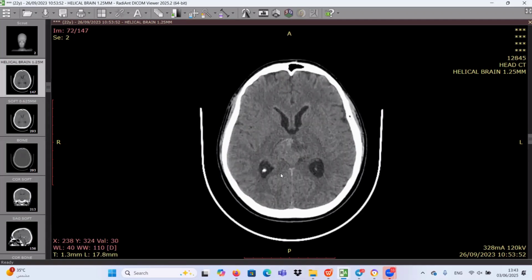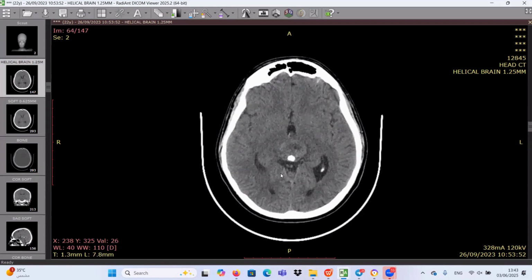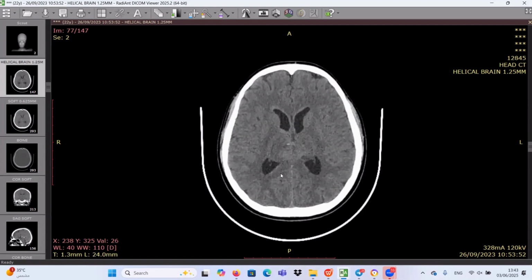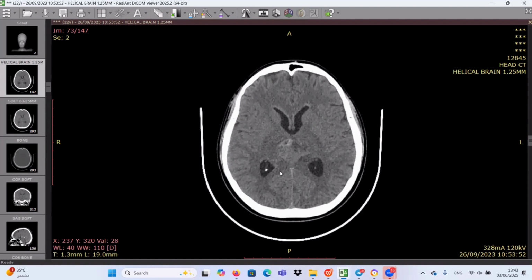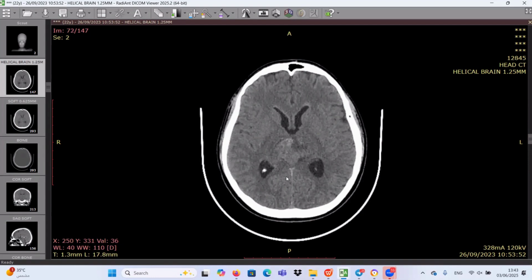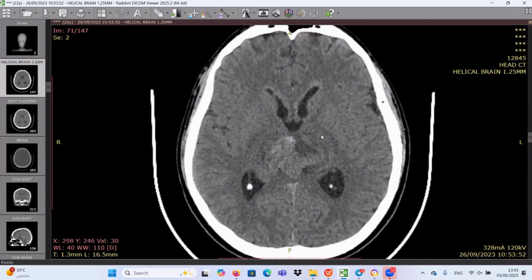And do you have any more extra abnormality? Is there any hydrocephalic changes? There is mild dilatation of both lateral ventricles. I agree with you. Okay. Do you have any more abnormalities? I am sorry that the CT scan was done without contrast. Okay. But let's try together to find any more abnormalities. Find any more? Okay. In both thalami, there is edematous changes, or I think it's mass effect on both thalami.